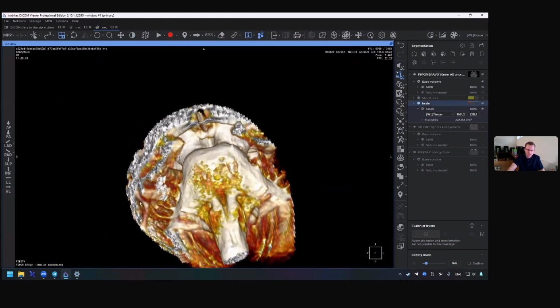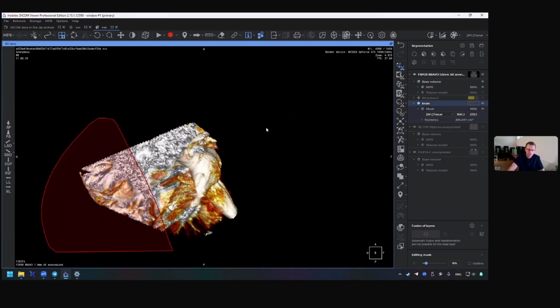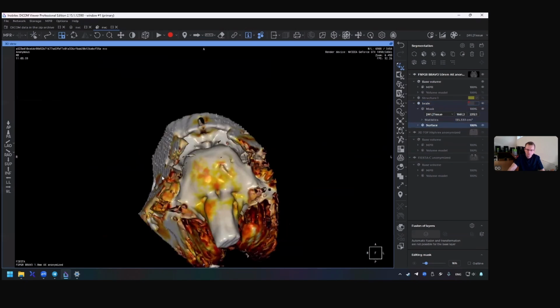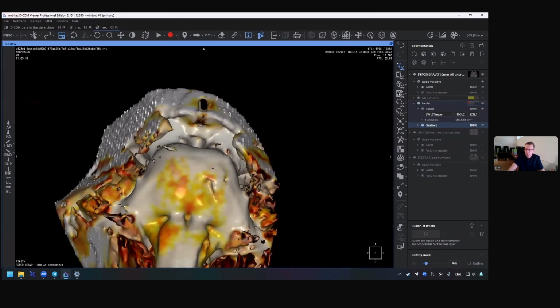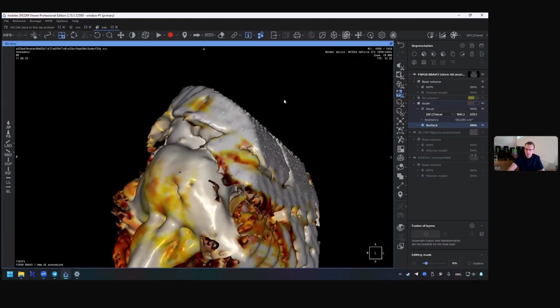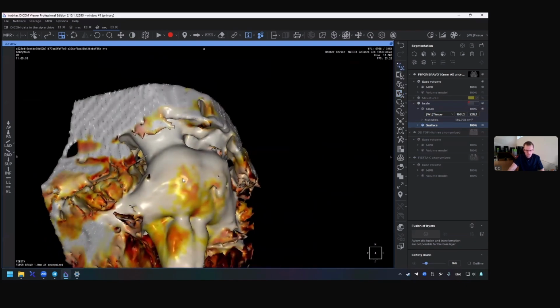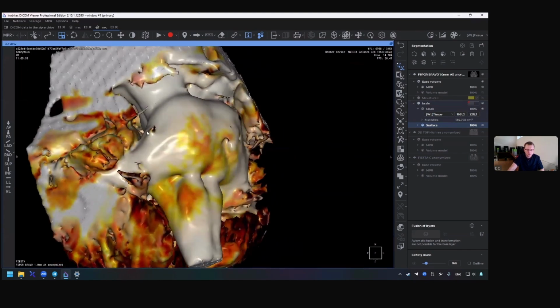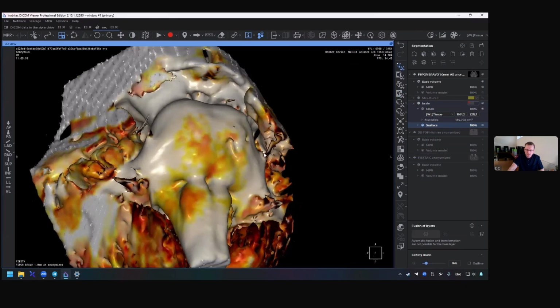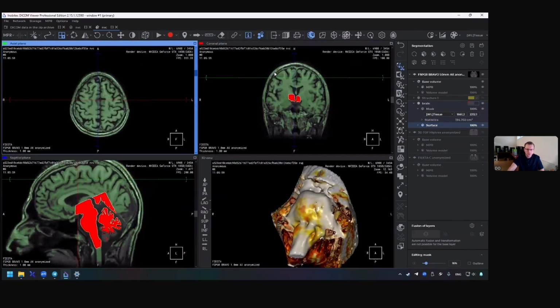And in many cases, I prefer to cover this voxel mass with surface, to wrap with surface. Let's cut all voxels except objects. Here we have brain stem, bones, trigeminal nerves. We need to make a separate segmentation of the trigeminal nerve, I think.